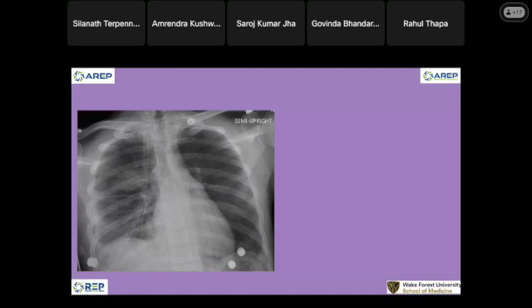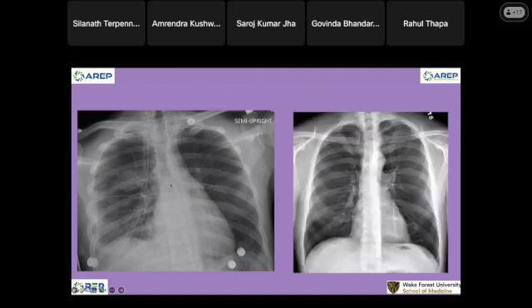When I say CR, I'm talking about how much we miss on chest radiograph. On this person, compared to normal, I don't know about this case. Okay, the left lung is abnormal, but I haven't looked at the history. But what is abnormal here? I'm going to show you how subtle lung cancer can be.